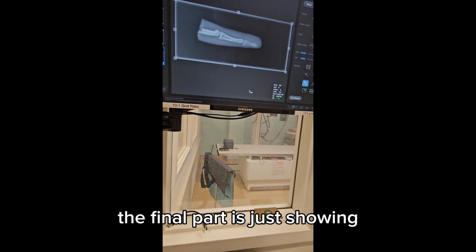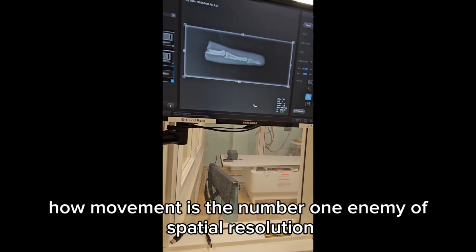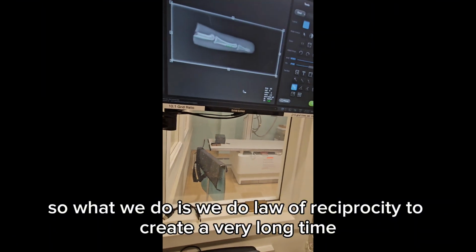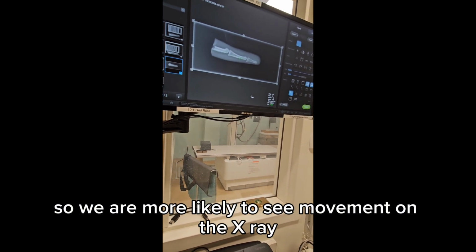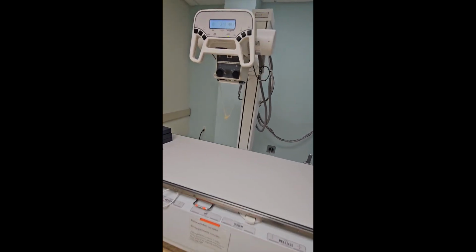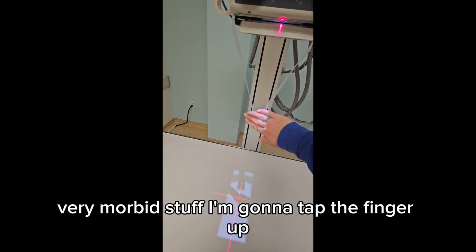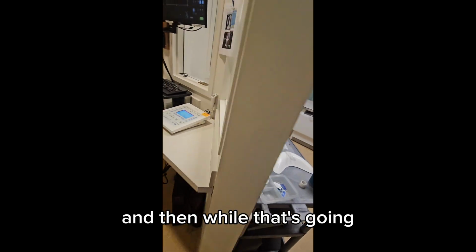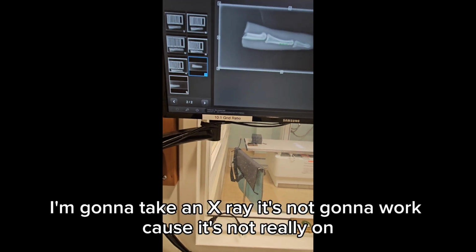Okay, and then the final part is just showing how movement is the #1 enemy of spatial resolution. So what we do is we do law of reciprocity to create a very long time so that we are more likely to see movement on the x-ray. And then I come out here, very morbid stuff. I'm going to tap the finger. Oh, it's moving, right? And then while that's going, I'm going to take an x-ray. It's not going to work because it's not really on.